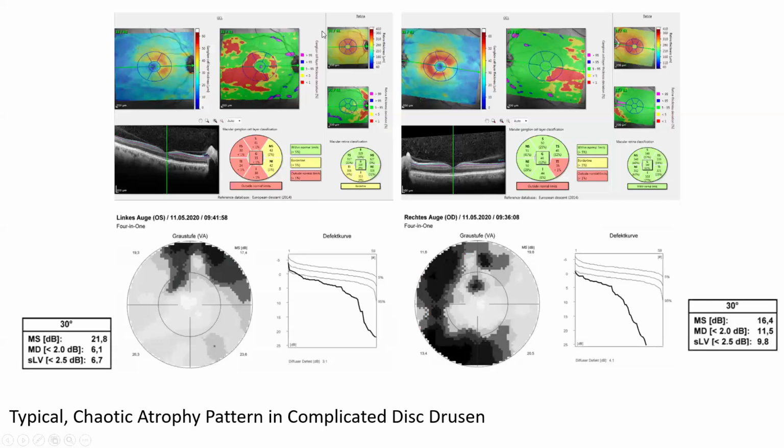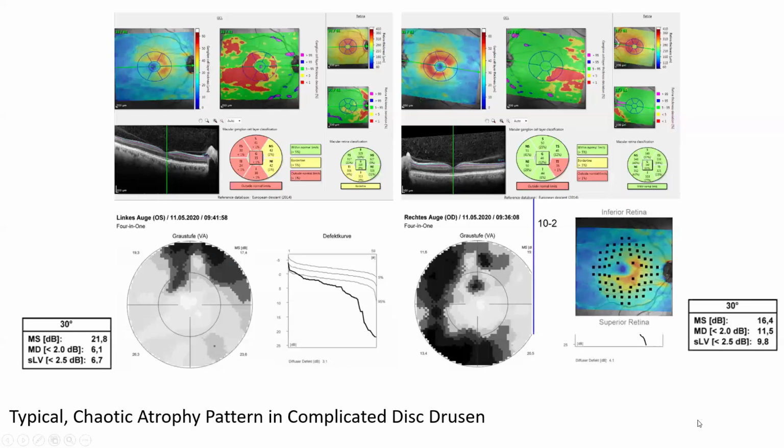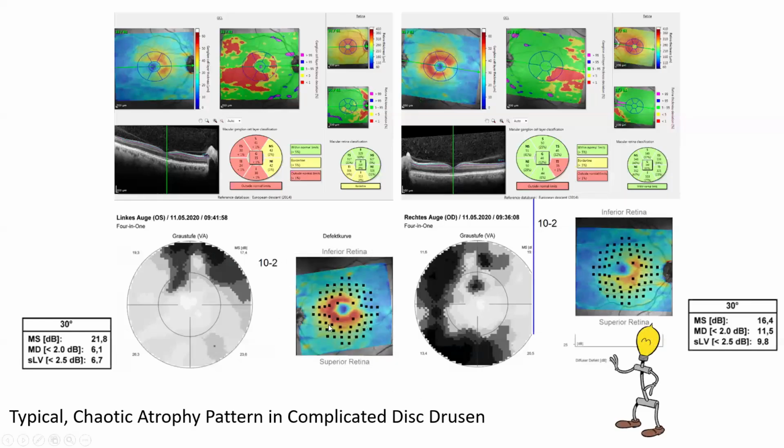This patient had a rather diffuse loss of ganglion cells, not respecting the midline horizontally or vertically in both eyes. It is a crazy pattern of atrophy, and therefore the visual field defects also have a very crazy pattern, which doesn't fit the cases we have discussed up to now, respecting the horizontal or vertical line. And when you do an overlay with the Hood graphic, you flip your ganglion cell layer image, and then you get a nice correlation upside down with the visual field defects.